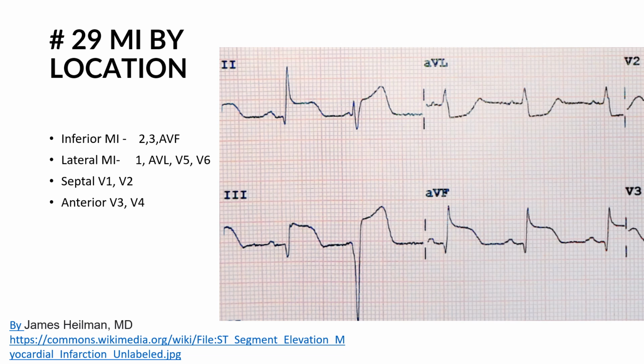So what exactly is a STEMI? What you're going to see is something that kind of looks like a fireman's hat. Right here's the bill. Right here's where they got the symbol to show, hey, look, I'm a firefighter, and then the crest of the hat goes over here. So what's going on right here? This is your ST segment. It's elevated, right? Your ST segment is elevated, and that's what you're looking for.